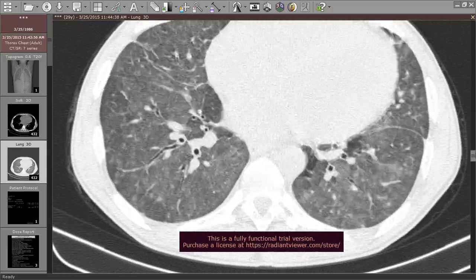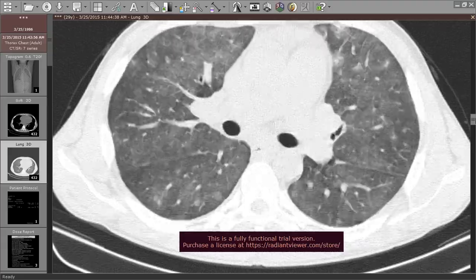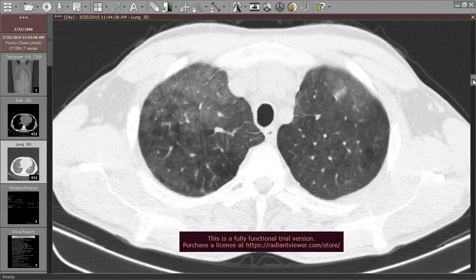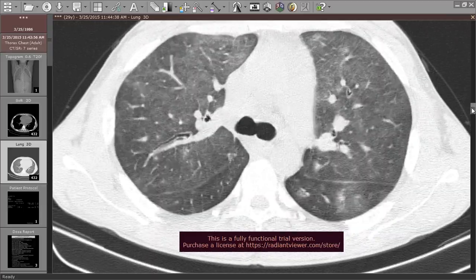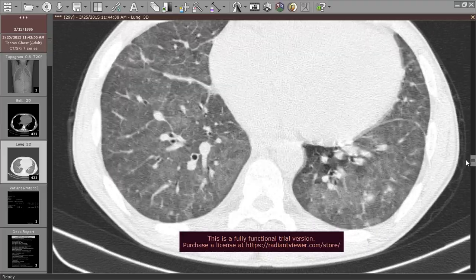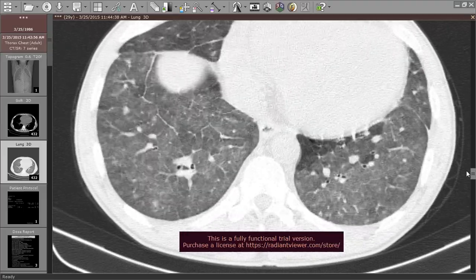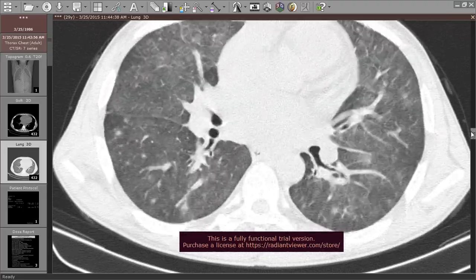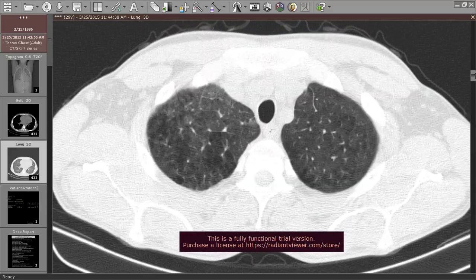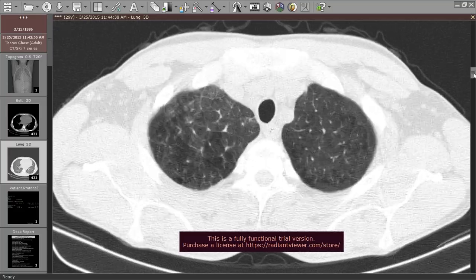Of course, here you cannot differentiate between invasive aspergillosis and relapse with leukemic infiltrations. Before 2010, the classic halo sign was described for invasive aspergillosis, and after 2010 it was described also for relapse or leukemic infiltration. Of course, here clinical and laboratory correlation is mandatory.